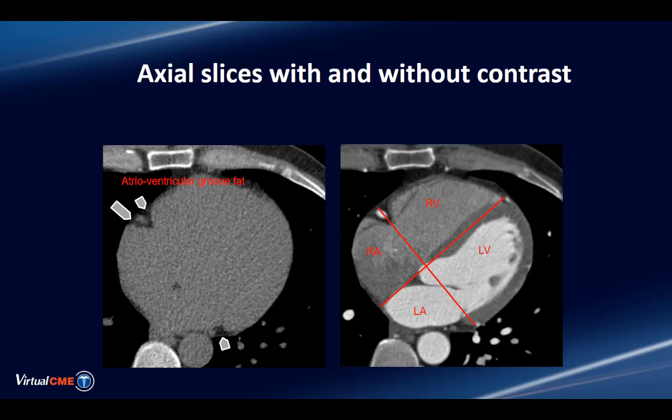But what I really wanted to illustrate is the perpendicular nature, the right angles that exist if one looks at the image plane going from the base of the heart out to the apex, and the image plane looking at the circumferential vessels here.